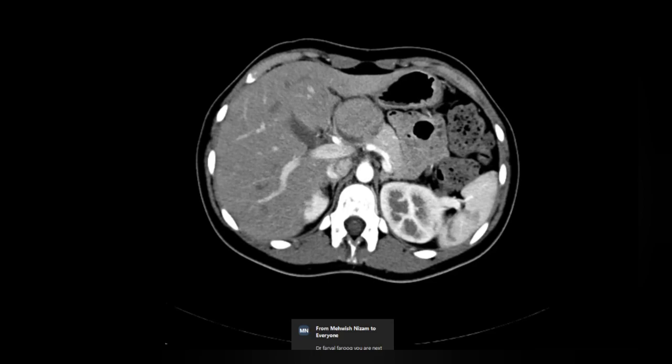Hello? Yes, I'm hearing you. I'm with you. Yes, sir. And it is not showing any contrast enhancement peripherally. The necrotic area is also evident. It is of fluid signal intensity with necrotic area causing some compressive effect on the left lobe of the liver, sir. Also the portal vein is free. The rest of the pancreas appears normal.